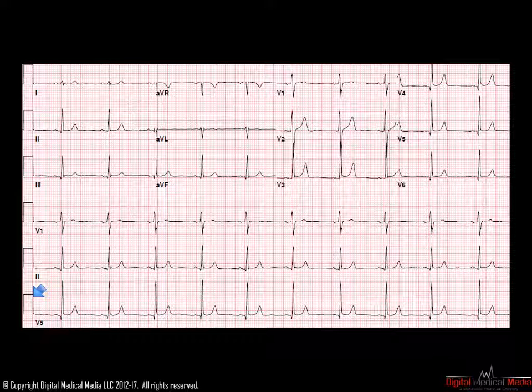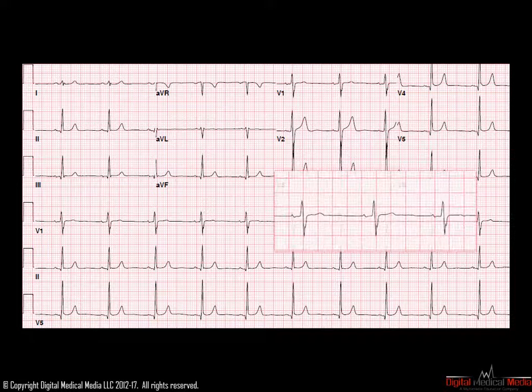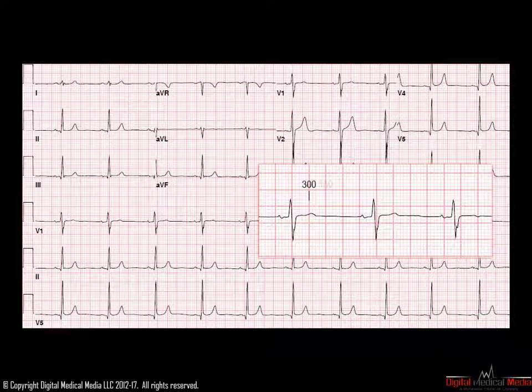First, we should look at the standardization signal at the beginning of the ECG. It is 5 millimeters wide, implying that the speed of the recording paper is normal. Now we find one QRS which is sitting on top of a large dark line, right here. We begin counting to the right: 300, 150, 100, 75, 60. This patient's heart rate is slightly faster than 60 beats per minute, 62 beats per minute.